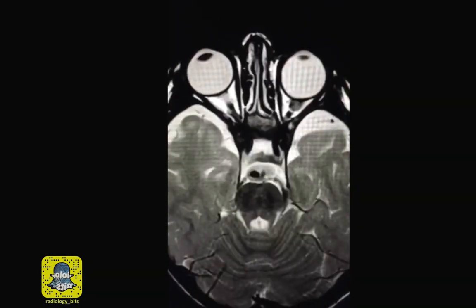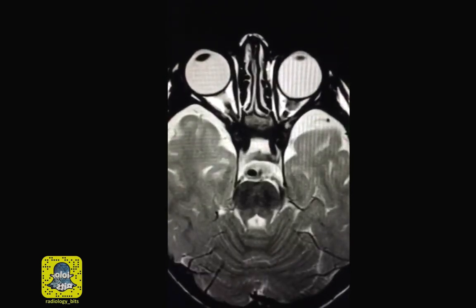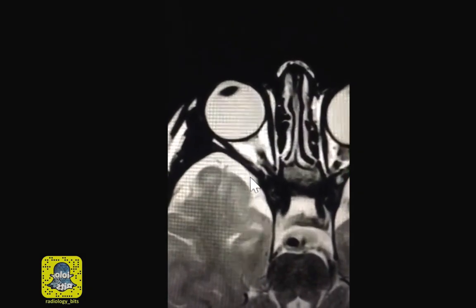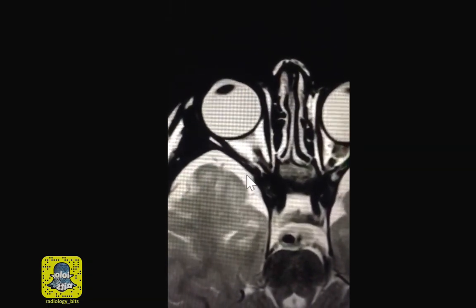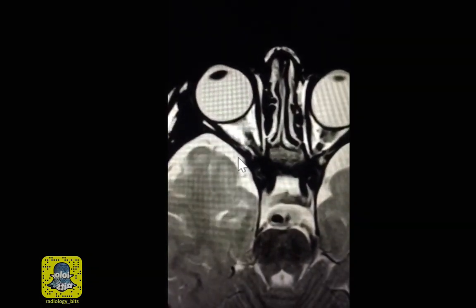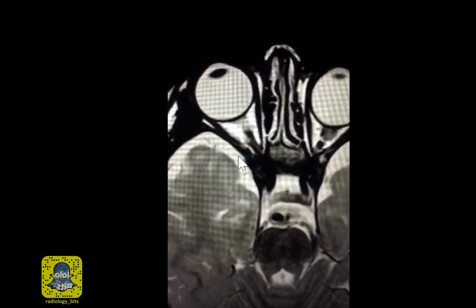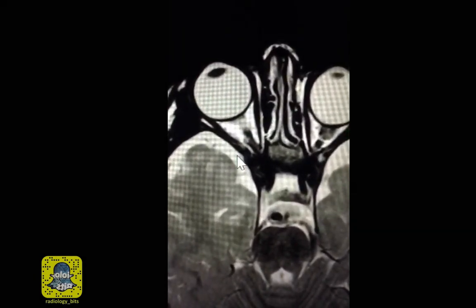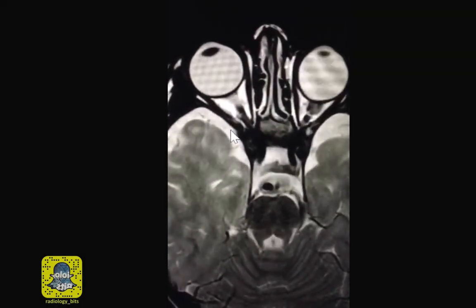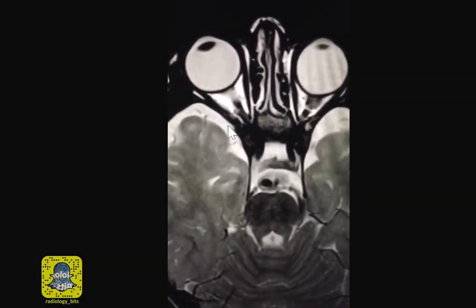As promised earlier this week, our last case of the week that we're showing here is a case that's advanced for seniors. However, before we proceed, for a junior audience, MRI is not a bad way to look at the orbits. We can use various sequences that we talked about before, T1 where fluid is dark, T2 where fluid is bright, contrast-enhanced sequences, and fat-saturated sequences. You can also look at the orbital components in sagittal, coronal reformats as well, which adds more information.